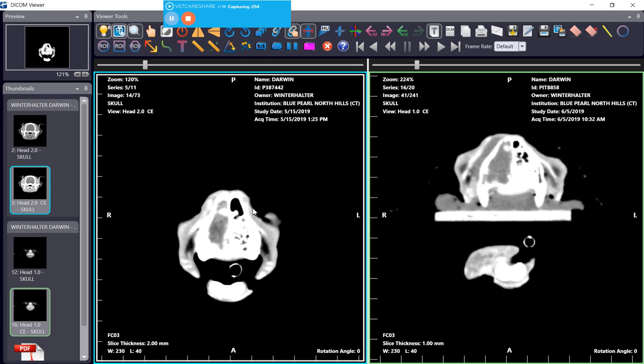This is normal skin over the top tissue of his nose, even though this airway is occluded, and on the left side it looks normal. If we look over here to the right-hand side of your screen, the one that was taken on June 5th, we have a lot of tissue out here between the skin and the bone of the nose, and so I'm sure he is having significant swelling on the right side of his face. And again, the inside of the nasal cavity is pretty much unchanged. It was already pretty well affected.